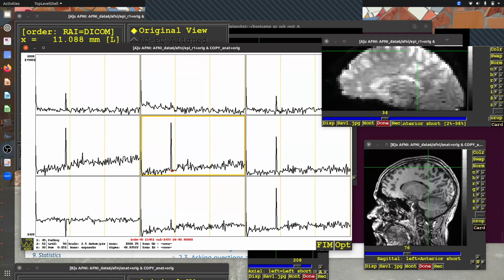All of this part that we're measuring here, all of this is the BOLD activity, the blood oxygenation level dependence. And so these are the things that we care about that are related to neuronal signal. This spike is physiological, but it's not really information we're going to be caring about in our analysis because it's something different than what the brain is directly doing.